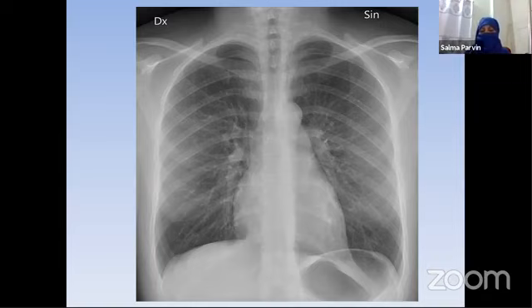But about the hemidiaphragms, I advocate that you go from the posterior ends of the ribs, because from the lateral view in humans, the posterior convexity of the hemidiaphragms, the height of the convexity, is nearer to the posterior half of the thoracic chest cavity rather than the mid or anterior aspect. So it's better to go through the posterior ends.